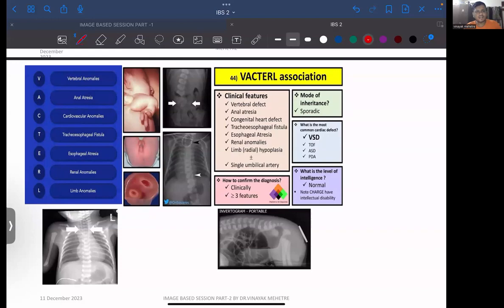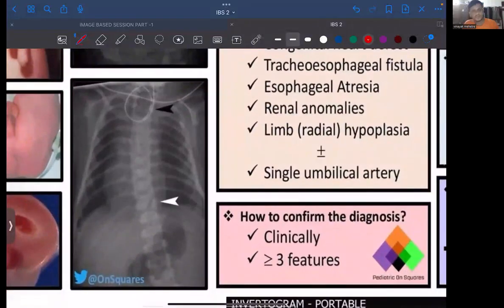Renal anomalies and limb anomalies. So first you got this patient. What do you think on seeing this? What do we have in this X-ray? What is this X-ray? Try to answer, this is a recent question, I have taught it and still people have got it wrong.